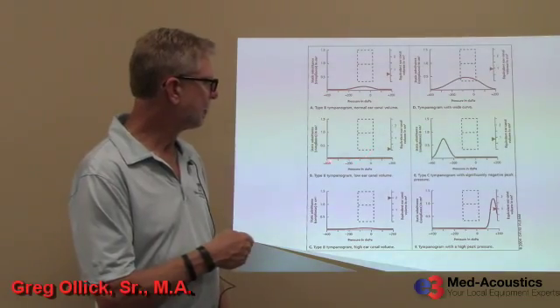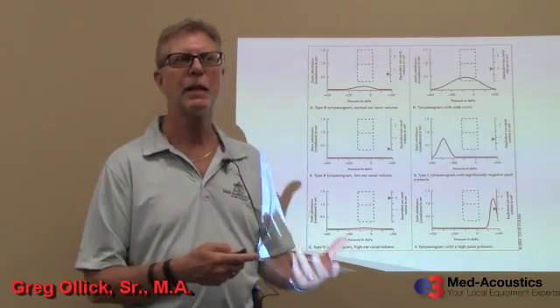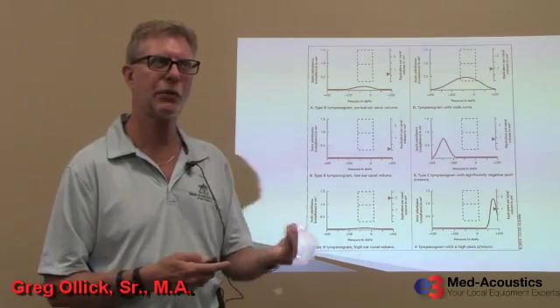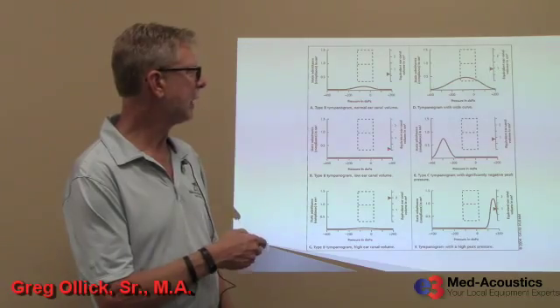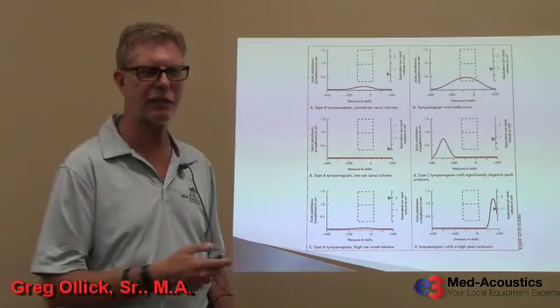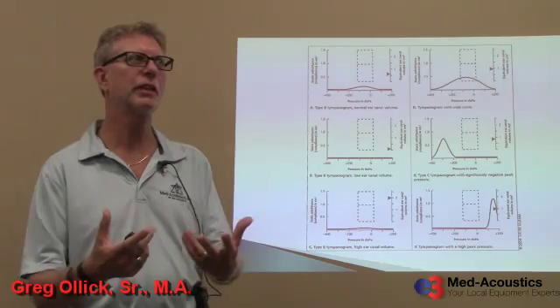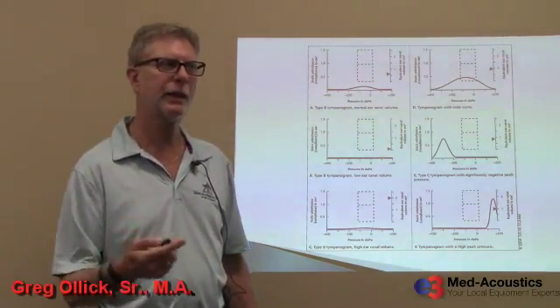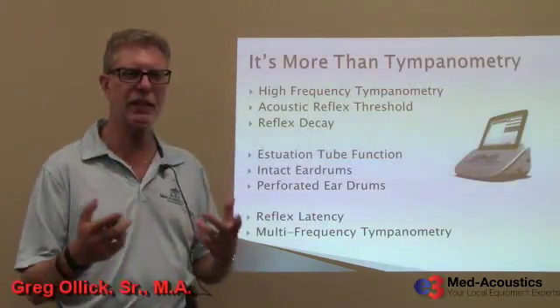Okay? If we get a flat tympanogram and a very, very low, much lower than normal reading, that might mean that there is a wax occlusion and we're not able to move the eardrum because of that, and that would also give us a low ear canal volume reading. If we have a normal ear canal volume reading and a flat or almost flat tympanogram, then we know there is a middle ear effusion. There's something preventing the eardrum from moving properly, probably fluid in the middle ear cavity. Right? So I hope that's helpful, but here's the other functions.